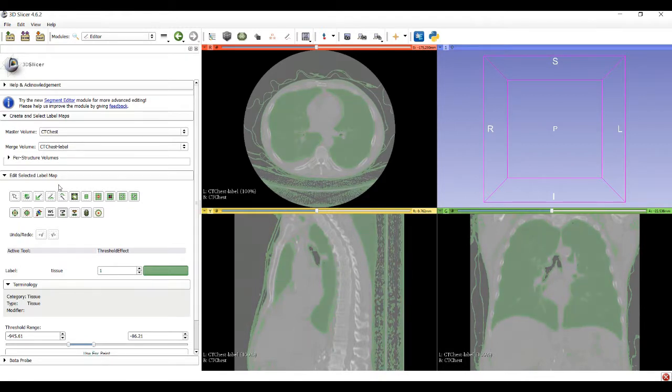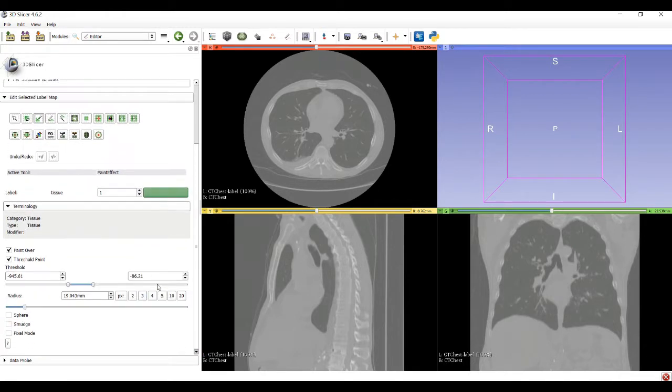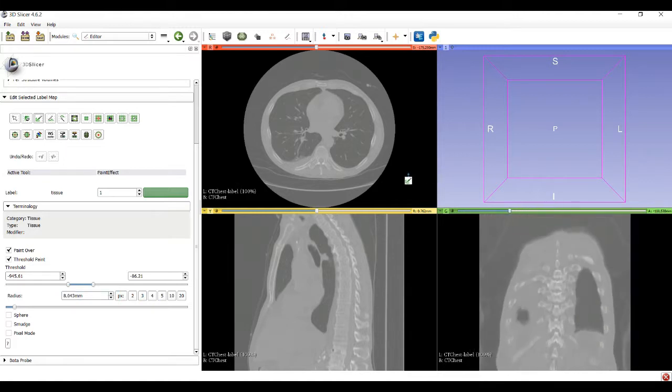The paint tool has several functions. It has some sizing, and then I can choose where on the images to highlight. Generally you want to move to a slide that starts the beginning of the organ in one direction and go from there. Because I chose the contrasting, I can actually be a little sloppy with my edges because the image processing will choose the part of the image that belongs to the lung in this case.